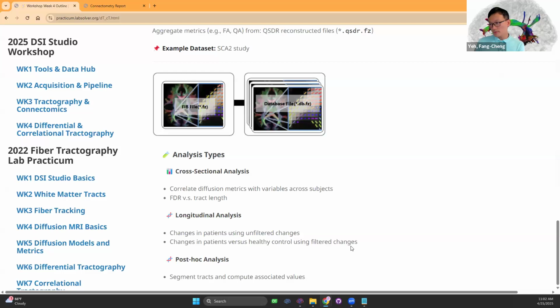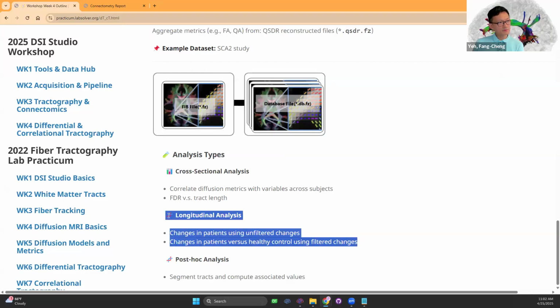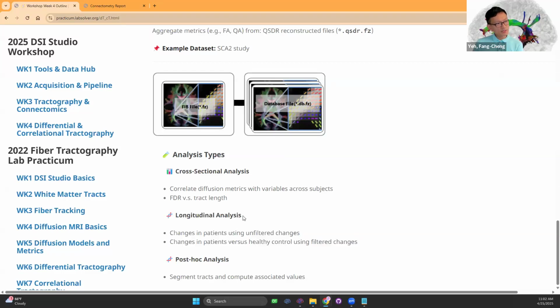The last session will be a little bit over time, but this will be real quick. We can do a longitudinal analysis.